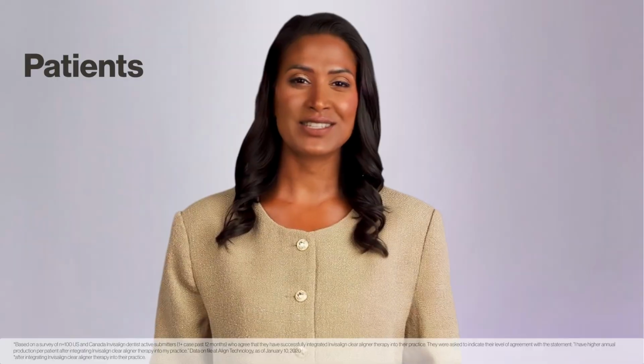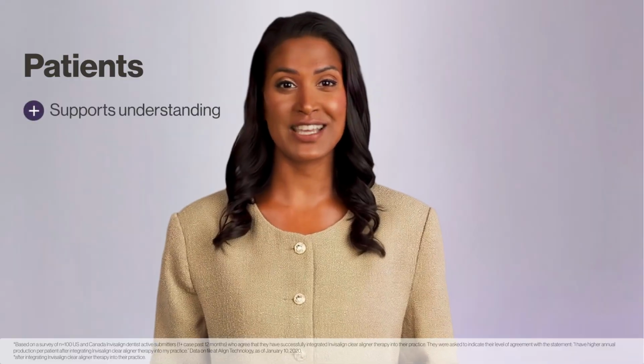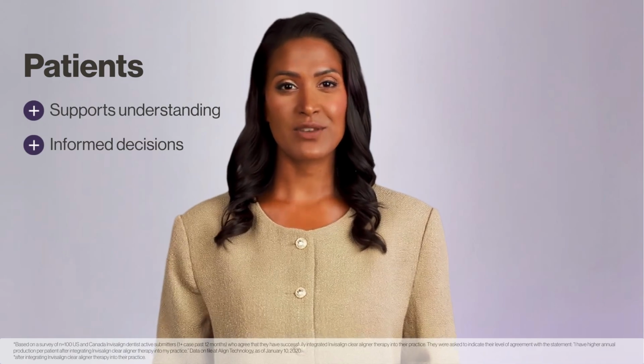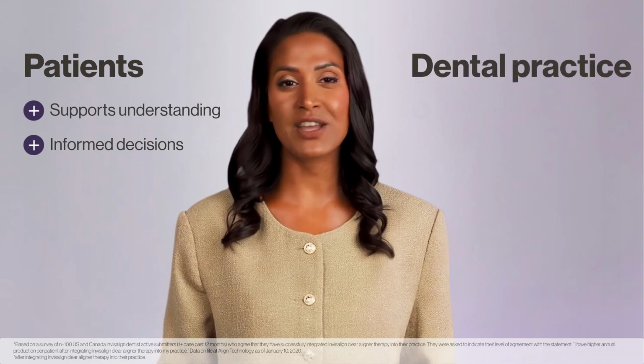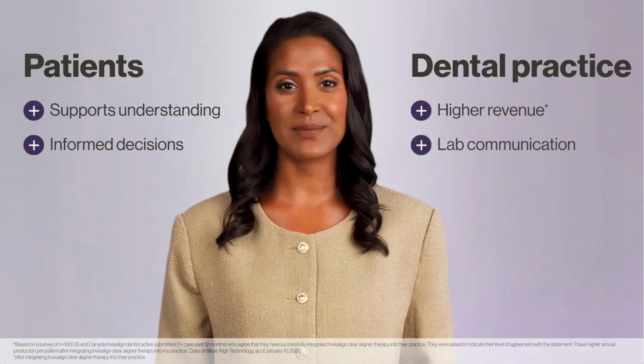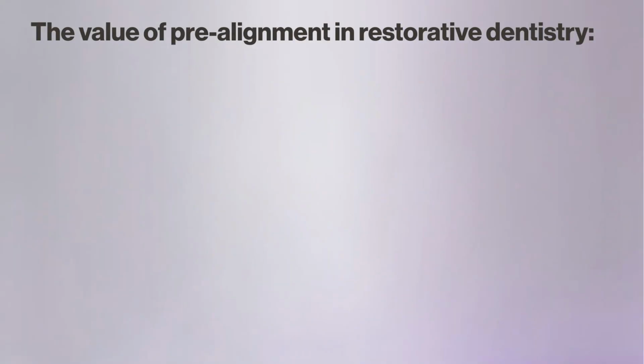For patients, this comprehensive oral health assessment supports patient understanding and helps them make informed decisions about the treatment plan. For the dental practice, it often means higher revenue compared to isolated treatments and closer collaboration with the dental lab. Let's take a look at the true scope of the multidisciplinary treatment.